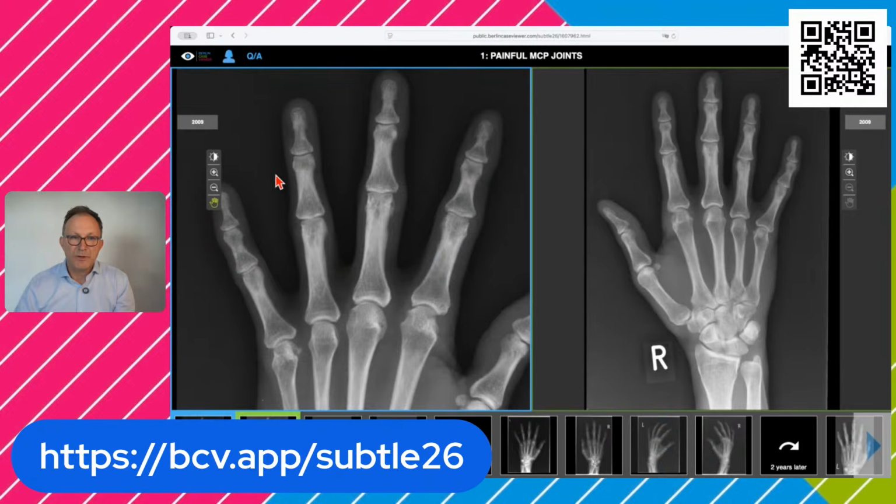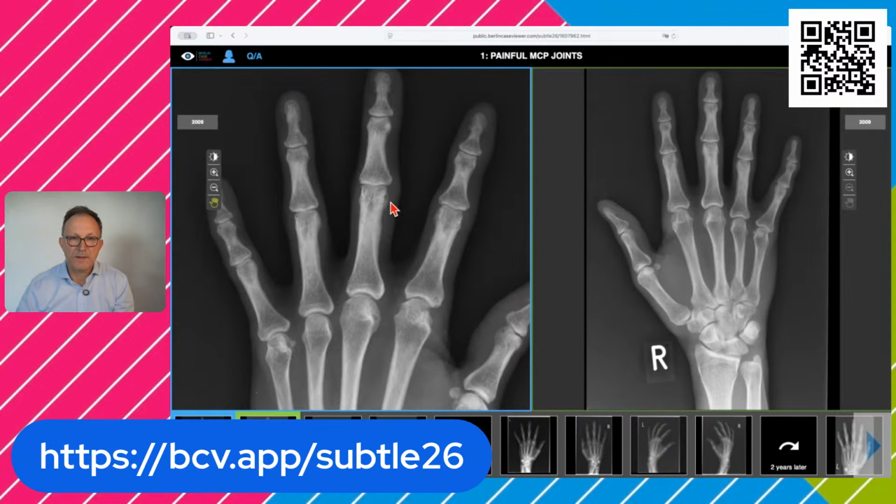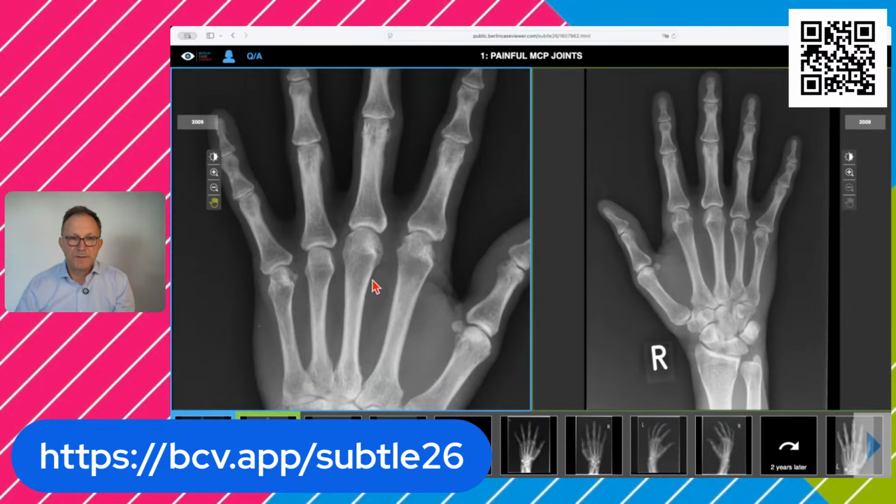So the DIP joints here, they look normal. The PIP joints, they maybe have smaller cystic changes, but I would not overreact when I see these kind of changes. MCP joints, the first MCP joint looks very nice.